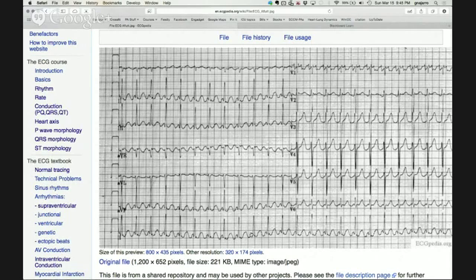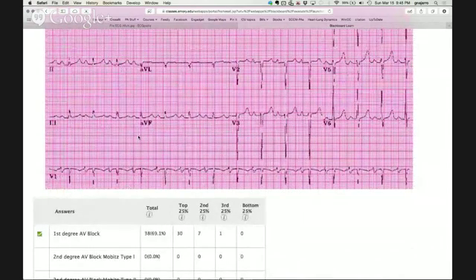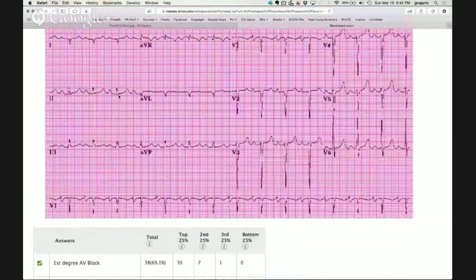And so the P waves will be at 300? Yeah, the P waves will be at a rate of around 300, plus or minus 10 beats, really. And then compared to the homework question, should the QRS complex be more exaggerated since it's not very prominent in lead 2? You mean in amplitude? Yes. No, the amplitude has nothing to do with the diagnosis of atrial flutter.